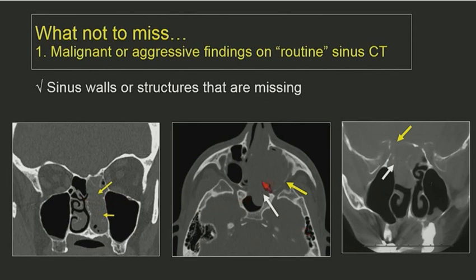Here's another patient. This was called a mucocele, and perhaps part of this is a mucocele, but not all of it. This posterior maxillary sinus wall is, again, the words I like to use, I use them all the time, thinned, deossified, dehiscent, and destroyed. And in fact, there are areas here where bone is destroyed. And notice this anterior wall of the sphenoid sinus is gone. That's destroyed. This is not sinusitis.